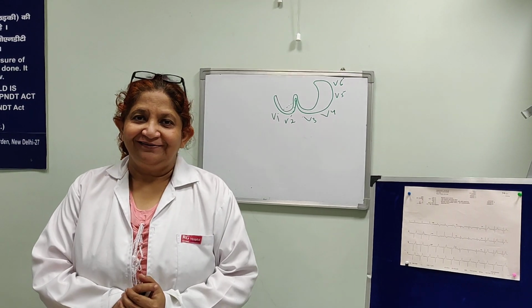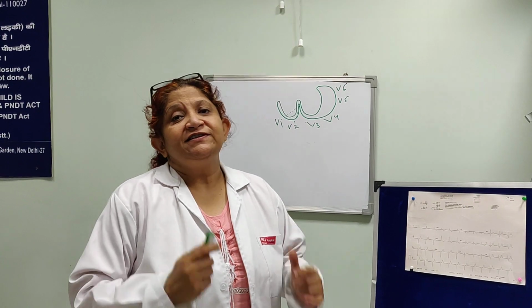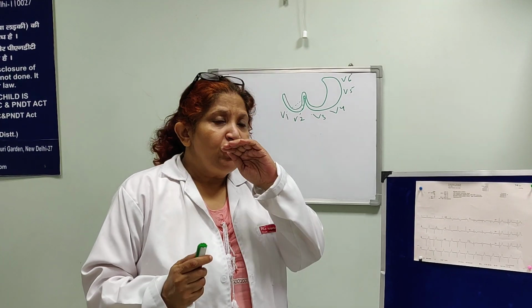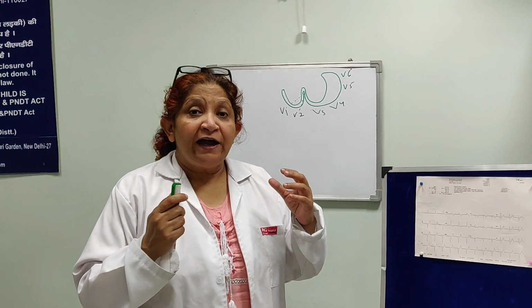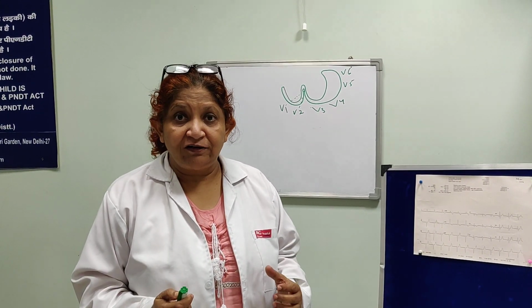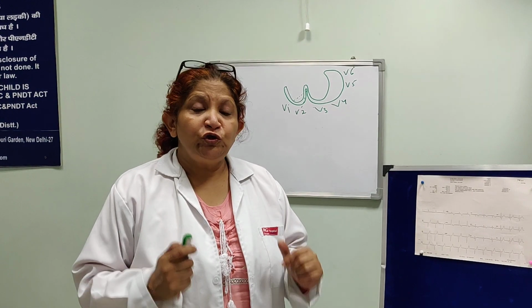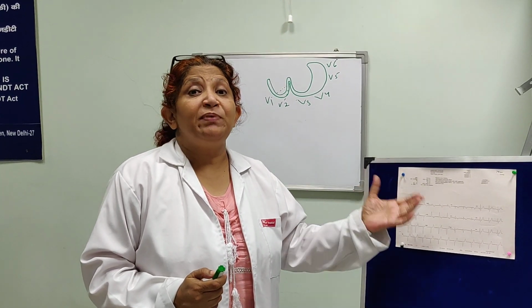Good morning all. Today we are going to revisit lead groups. That means the different groups of leads that look at the heart from different views, so we can diagnose diseases, especially myocardial infarction of the different wall segments as per the lead groups. And I am going to show you the lead groups directly on the ECG paper.